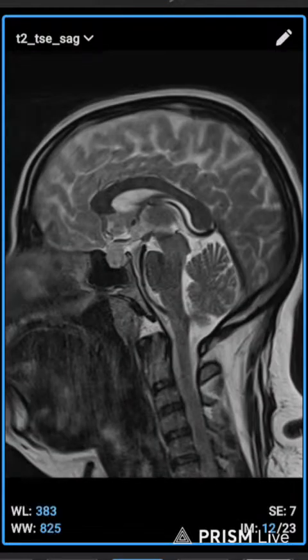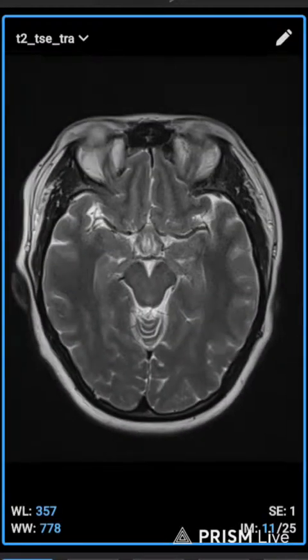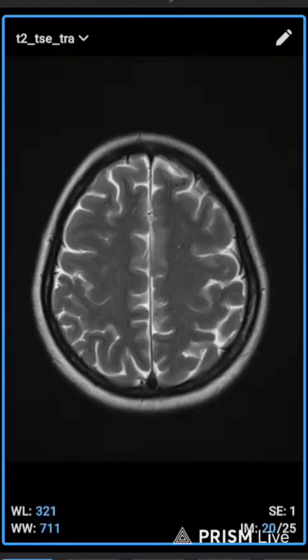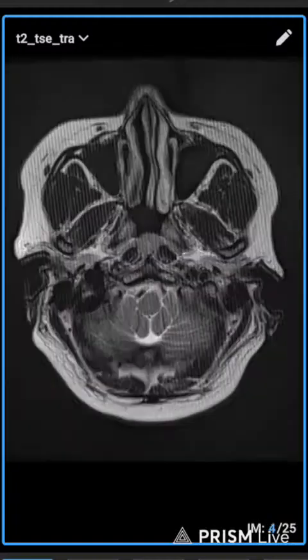So after the patient shows a high level, the doctor advises an MRI brain. It's important to note down the prolactin level of the patient. The advice is MRI brain pituitary dynamic.